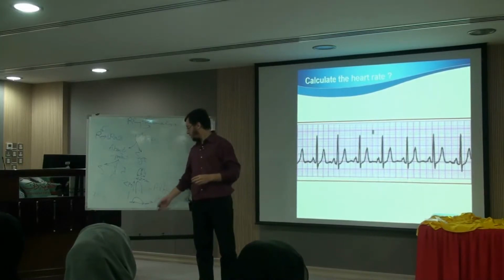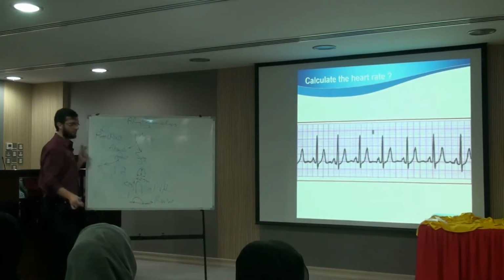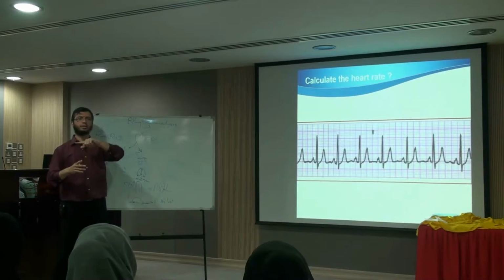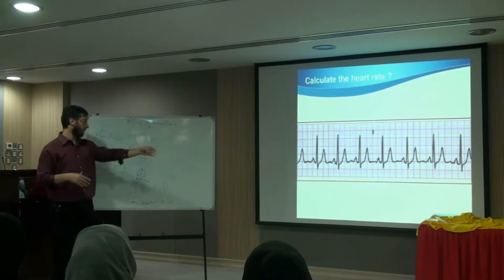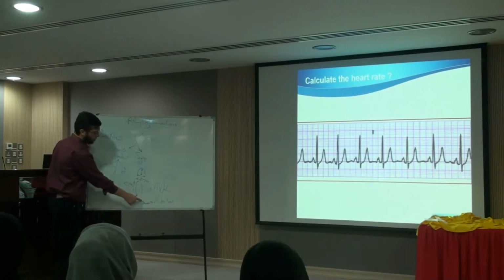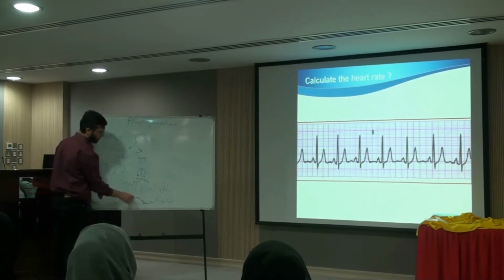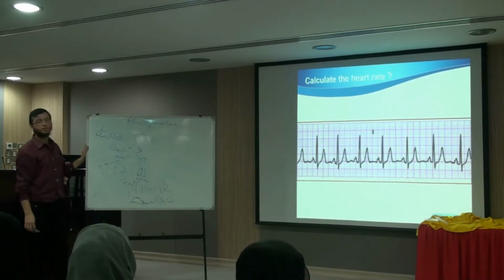Okay? The P mitral, if the atria now is dilated, it will take longer time to depolarize the atria because it was dilated. So it needs more time for the depolarization, so the width will increase. Usually here it is also bifid, like the M shape. So this M shape is like the M of mitral. This is tall like the P. Easy so far?